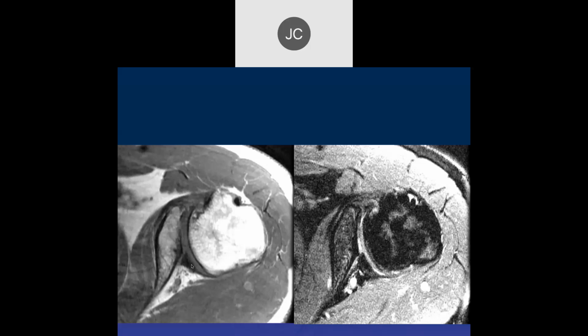And this anatomy is quite abnormal. Yes, it is. Now, the interesting thing about this is that it allows patients to have increased mobility, and therefore this kind of congenital variation of the glenoid, maybe not quite this severe, is seen disproportionately in young Little League pitchers.